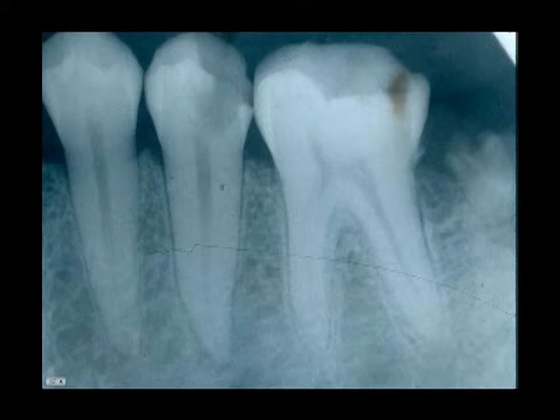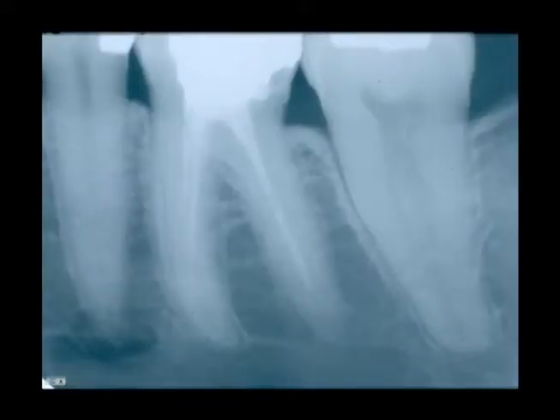Here we see a case of caries on a tooth. One can see at the apex the discontinuation of the lamina dura, the rarefaction of the bone, and rarefying osteitis. This tooth would test non-vital. On another radiograph, although we can see a restoration, it's not impinging on the pulp horn, but the pulp horn may be small enough that it has, and we can see a radiolucency at the apex.